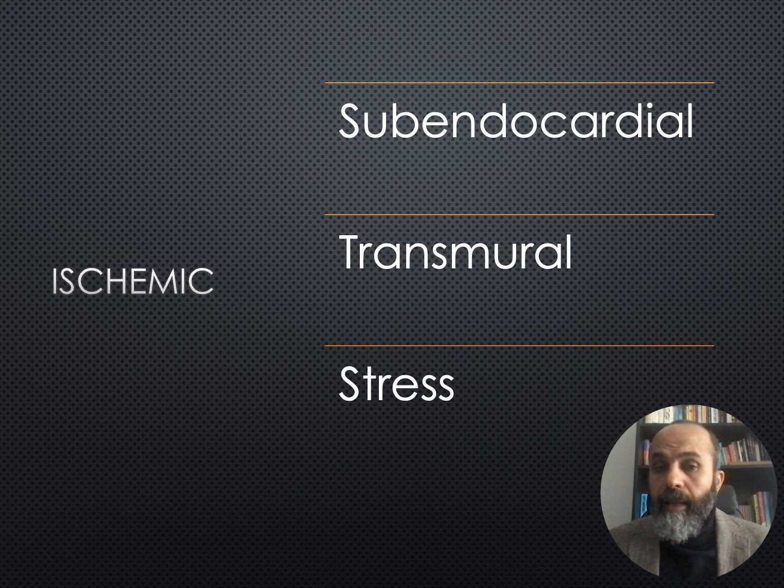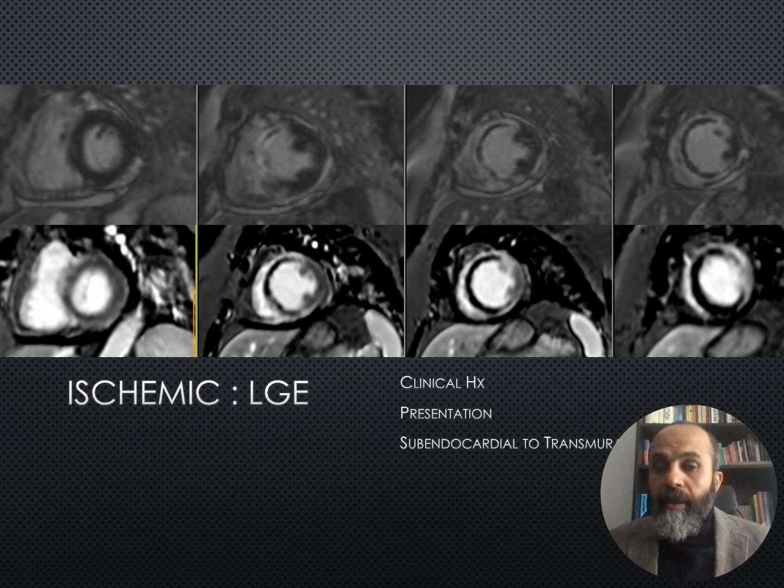Here in this case it's the LAD, and we know from the cine, from the edema, it's telling me already what is expected to see in the gadolinium enhancement image. So now in my head, if it's a viability study, then possibly we will need to do early GAD plus the late GAD. Early GAD usually is 1 or 2 minutes after contrast injection, as opposed to the late GAD, which is 5 minutes plus after the gadolinium, in order to identify areas of thrombi or MVO, similar in this case.